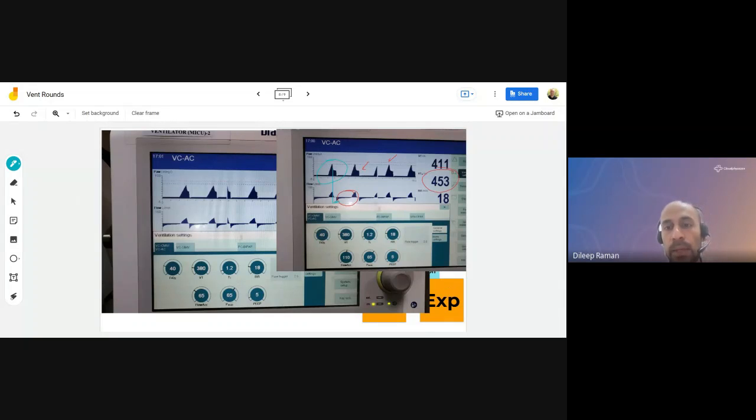That more time is because of this 1.2 setting. Because the flow acceleration was faster, the breath got delivered quickly, it stopped there. And you compare that to here, there is less time interval here. And it didn't reach this Pmax threshold that quickly. Okay.